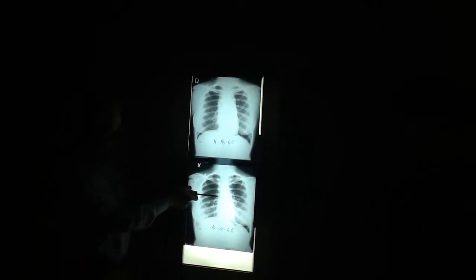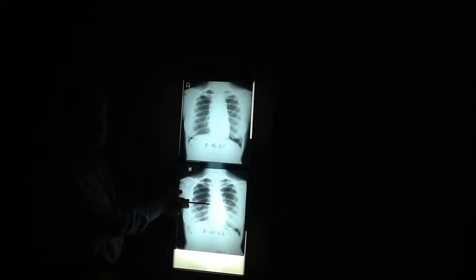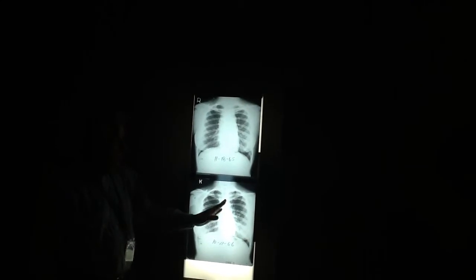This is better, even though it's almost a year later. It shifts it to the right and top. It's wider, isn't it? This is wider than it is on this one. Now, I wouldn't say this one's normal, but this one's closer to normal than this one is. It's wider, and it's also kind of well-defined, a little bit scalloped and kind of lumpy looking.